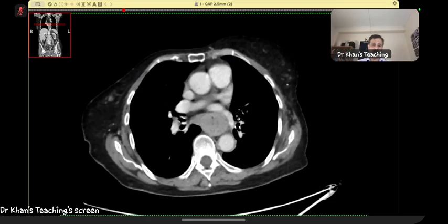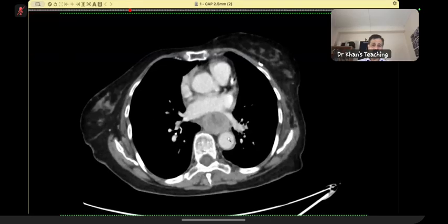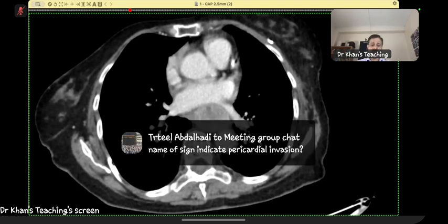Now, second thing is the fine touch about the aorta. Now, if you see here in this region, the contact between the tumor and the aorta is less than 90 degrees, which was correctly identified, but it is more than 45.